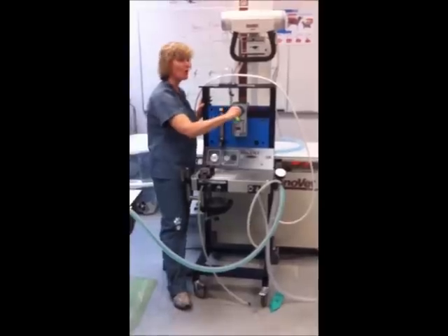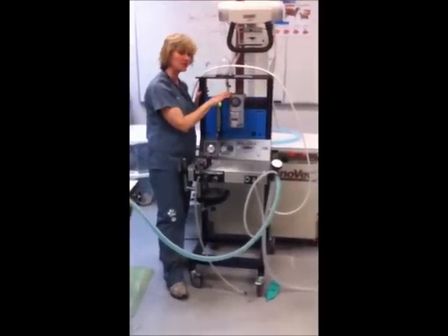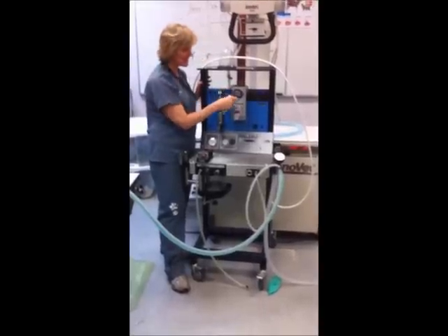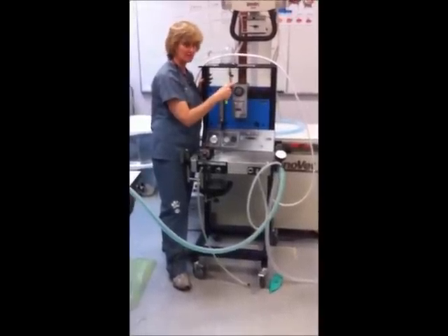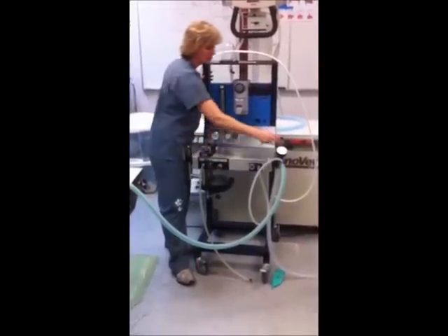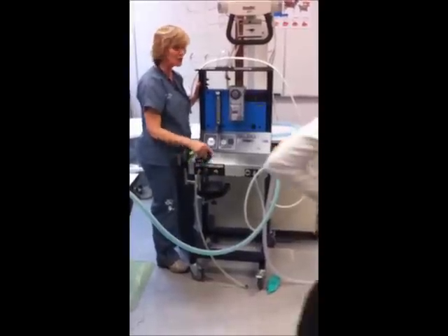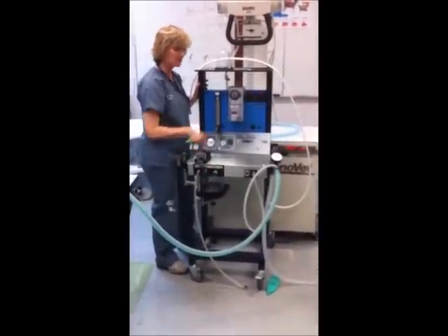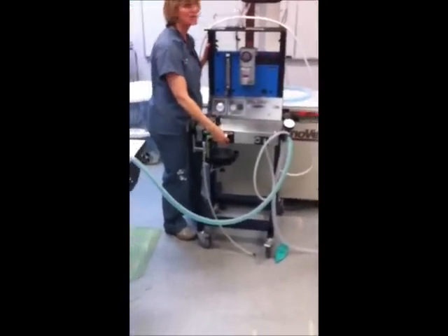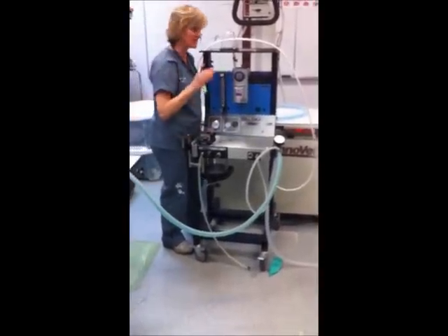The vaporizer, I won't be saying you've got to figure out how much to give this animal. You don't have to do that, but you do need to know where the vaporizer is. You need to know what the vaporizer does, and that it actually is set in percentages. Okay? The other thing that I don't require you do, though I find students do it anyway, and I'm fine with it, I don't ask you to ensure that the pop-off valve is open. It should always be open in the systems I'm teaching you. There are other systems that don't do that, but I'm not going to be checking to make sure that you're ensuring it's open or closed. Those are the things I won't be testing you on.